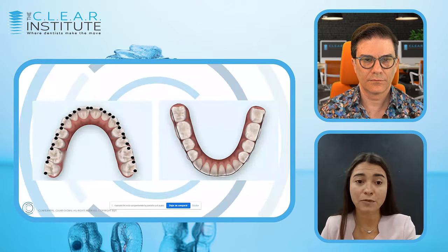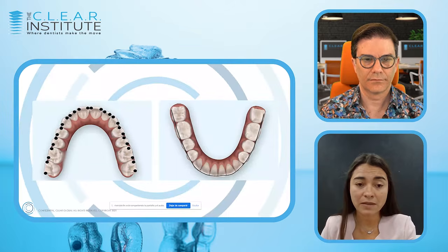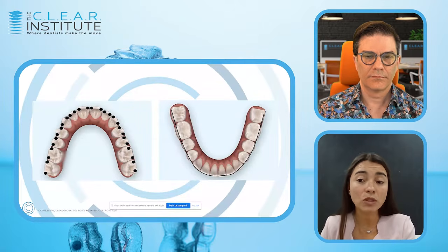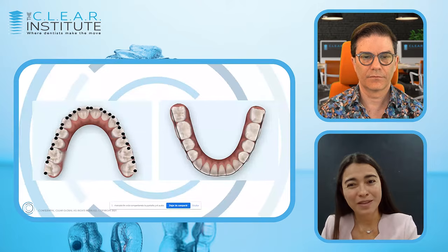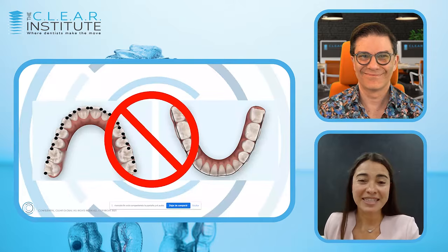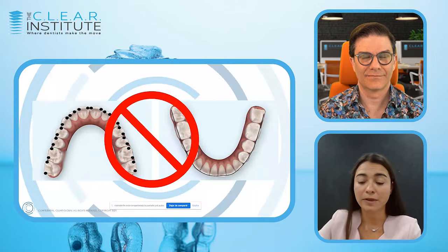Clear aligner software identifies the mesial and distal surfaces of the teeth and the center of the tooth, and it knows preset arch forms and aligns or snaps the teeth into an ideal position. But historically, doctors think that this is a treatment plan, and it is not. This is a setup, and a setup is the process done by the technicians with the clear aligner software.